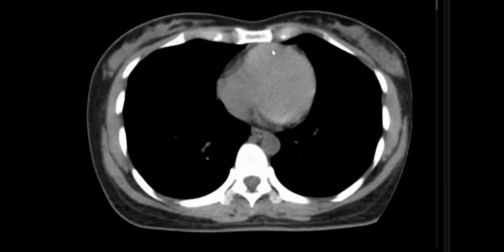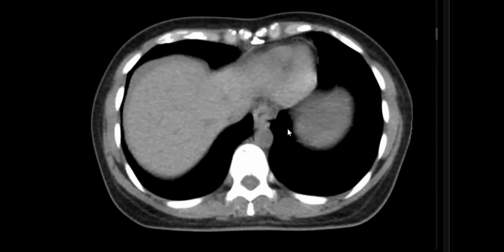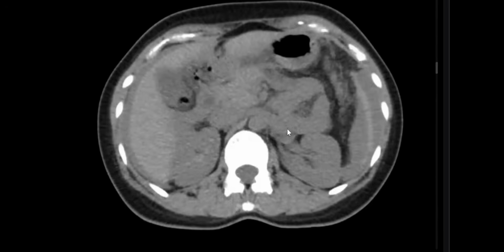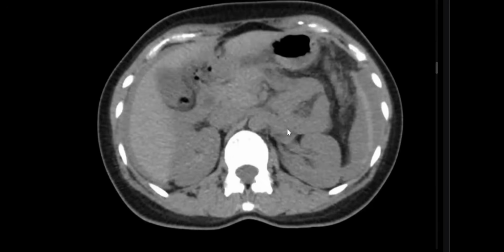Another patient, same complaint. Acute pelvic pain, middle age. You can scroll. I don't have the control yet. You have it. Yeah, I think I do now. I'm presented with the axial CT. I don't think this is a contrast study. It doesn't have any contrast. The patient is complaining of acute pelvic pain.